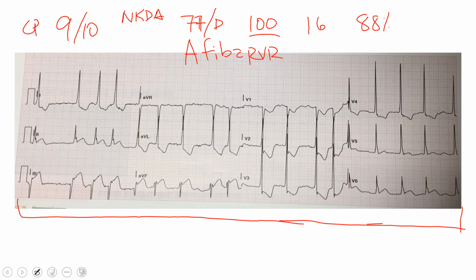Because it is an AFib, it's irregularly irregular. So there's going to be times where this is 130, 140 beats, and sometimes where it's going to be 100. So it's a big range. So let's go ahead and take a look at our 12 lead.